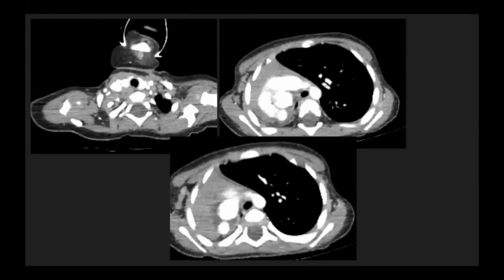Now, a CT was done. Let's see what is happening in the CT. These are the consecutive sections of a contrast enhanced scan. And here what we see, this is the arch, because there is no lung. So the mediastinum has rotated to the right side. This soft tissue in the anterior mediastinum here may create a lot of confusion, but it is actually the thymus.